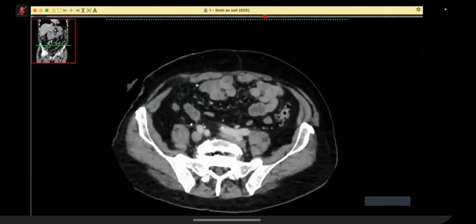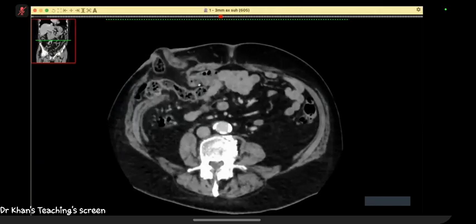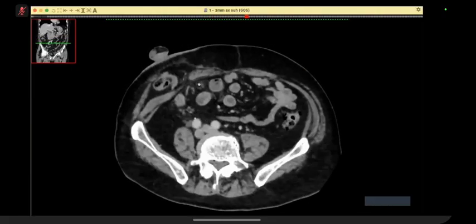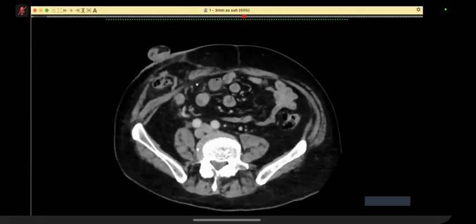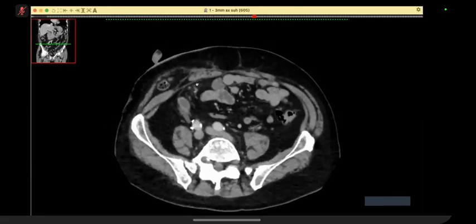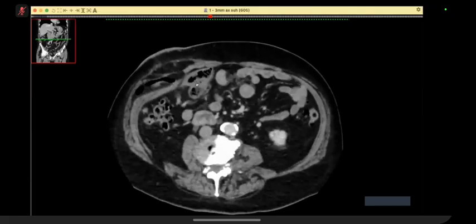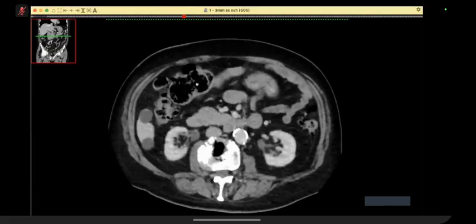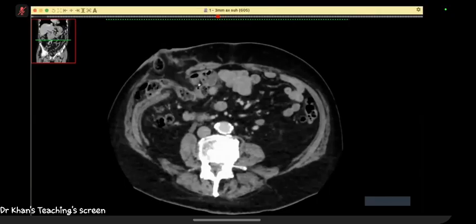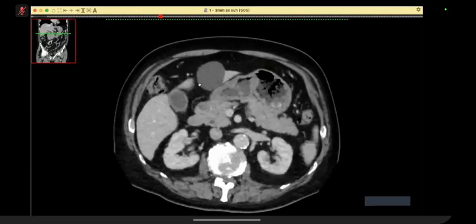denoting the urology surgery, and there is an anterior abdominal defect seen on the right abdominal quadrant, likely with bowel loops connecting into it, so likely a hernia, and there are atherosclerotic changes within the abdominal aorta, as well as the lumbar vertebrae.